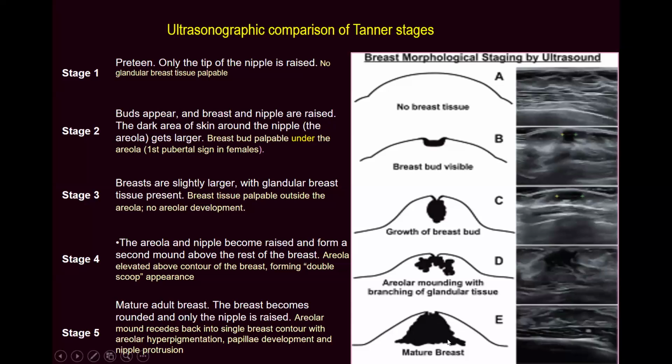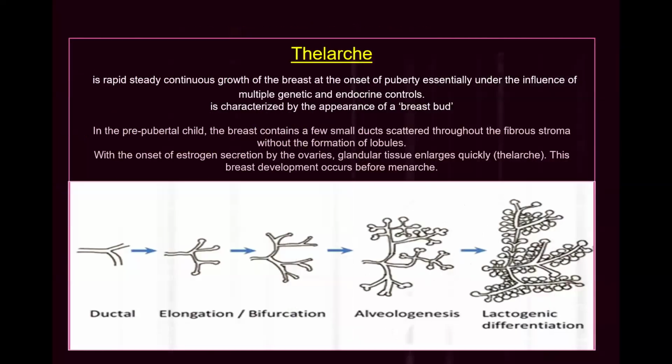And lacking the central hypoechogenicity. It's supposed not to be like that. It will be diffused throughout the breast. There is no central hypoechogenicity and peripheral hyperechogenicity. It will be seen, this iso or hypoechogenicity will scatter throughout the breast. And you know, what does it represent? As we mentioned earlier, the primitive ductal system in a prepubertal child contains just a rudimentary ductal system and stroma that represent Tanner stage 1, the ill-defined hyperechogenicity.